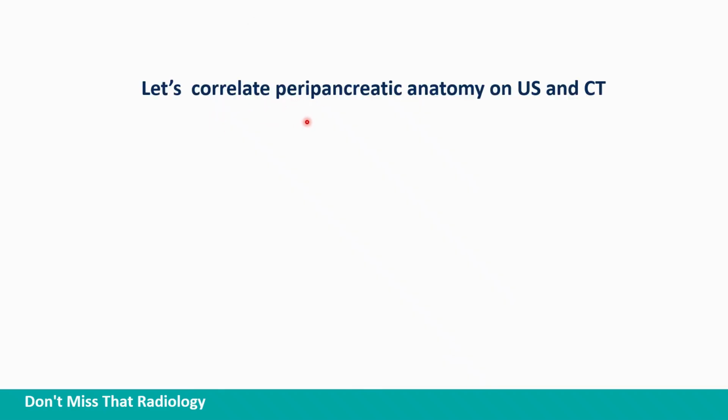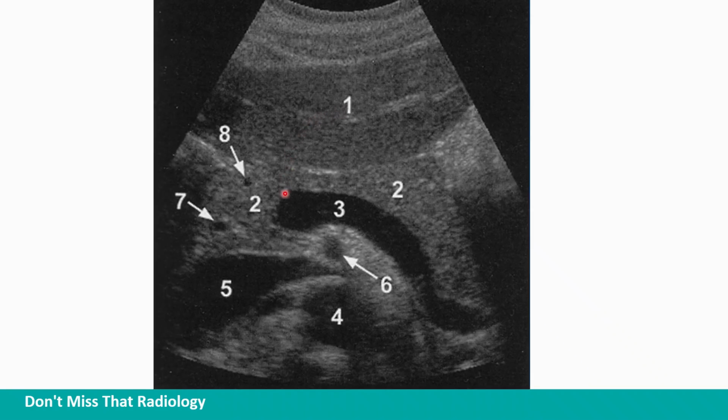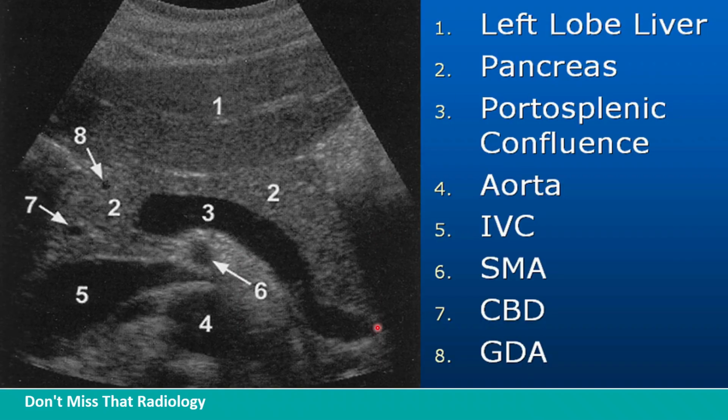Okay, so this brings us to a great point where we can start having fun. We are going to correlate peripancreatic anatomy on ultrasound and CT. I did a TikTok for this. This is one of my highest rated TikToks, basically just an unknown slide with the answers next to it.